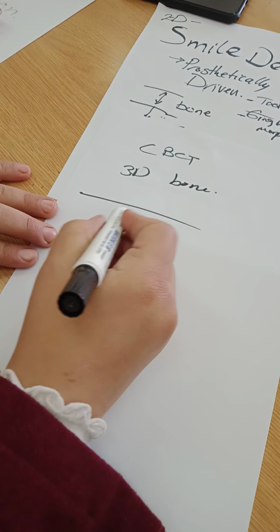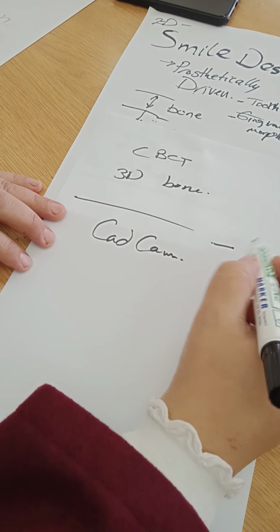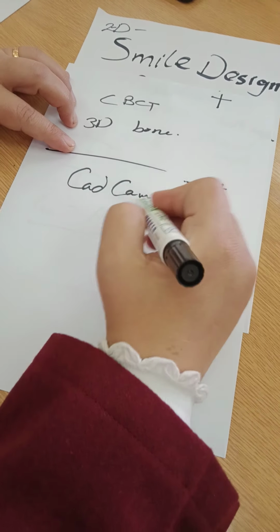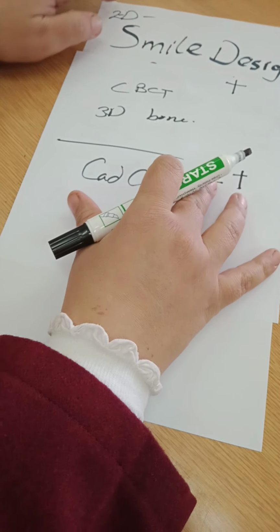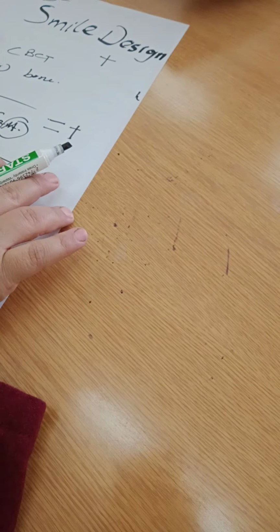And then we get the digital procedures of the CAD/CAM, where I design using the computer my final prosthesis, or even a temporary if I want to try it, and I mill them as well. So what I'm looking for is something combining these. I want an electronic or digital flow system that combines the smile design with the CBCT and with the CAD/CAM milling procedures. I need the milling part of the CAD/CAM, so I need to mill. So I'm doing all of this electronically. I'm not aware of any system. I will show you some of the systems that I found. I found this system on YouTube.